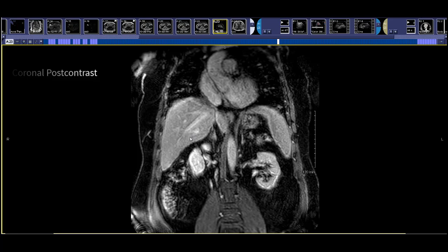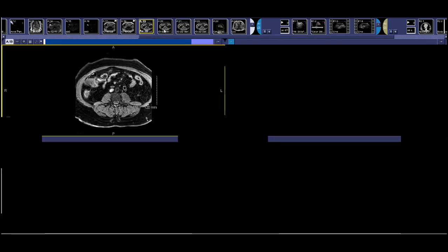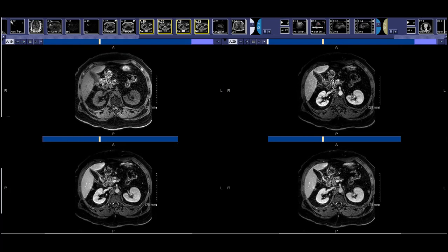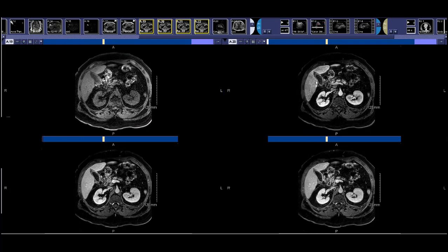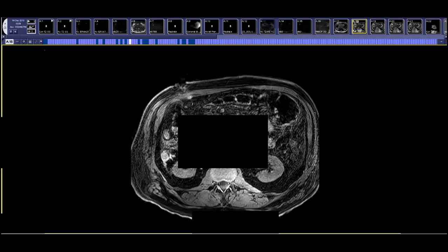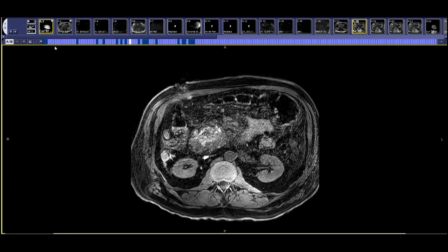So just to wrap this up, we saw the gallbladder contained stones, had pericholecystic fluid and inflammatory change. We can see on the contrast that it shows progressive delayed enhancement of the gallbladder wall, and this was a surgically proven case of chronic cholecystitis. I think it's difficult to tell without clinical information in this case if it was acute or chronic, but on surgery this was chronic. I have one more case here just to show an abnormality in the bile ducts.